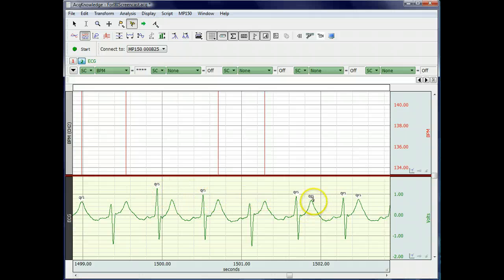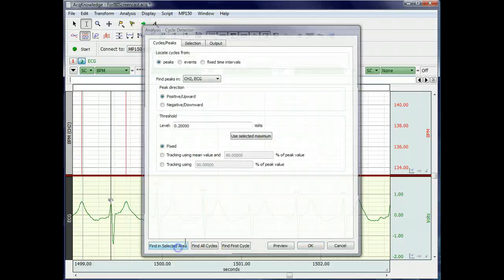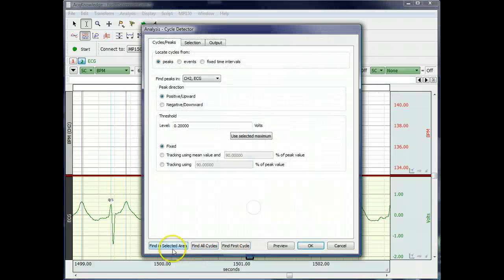This is a particularly bad set in the sense that this ECG is rather abnormal. Ordinarily you would not have so many T waves that are so large compared to the R waves, and the S waves wouldn't be so large. Losing my train of thought there, okay.